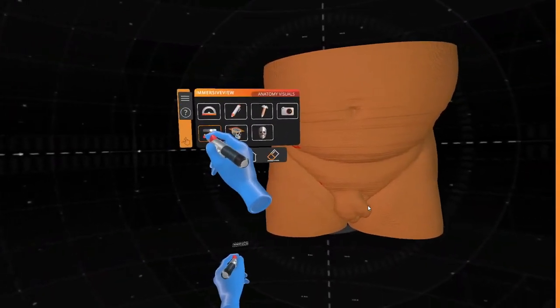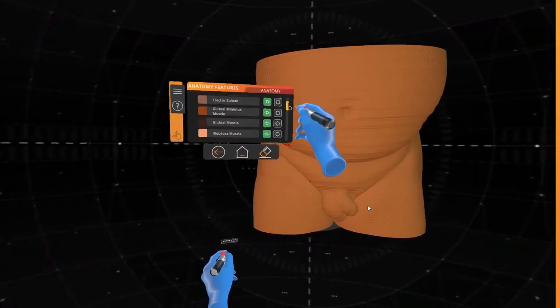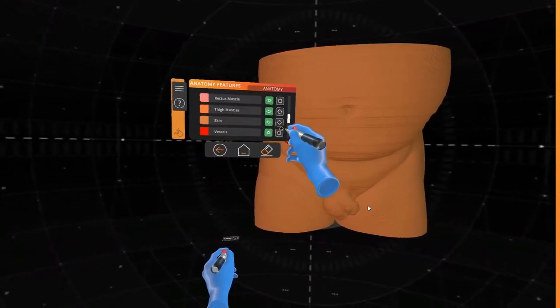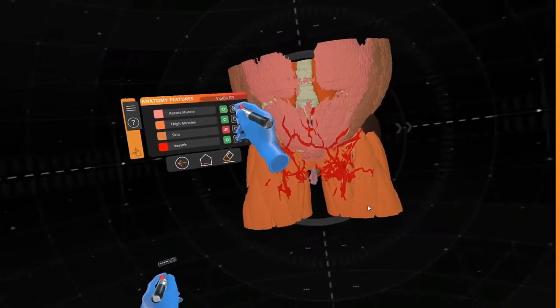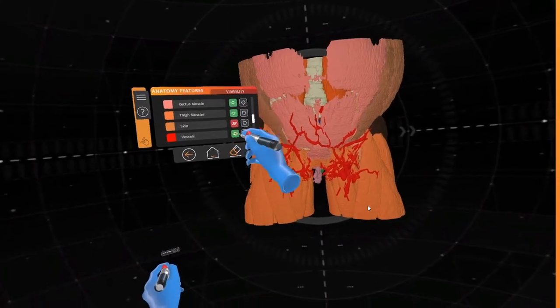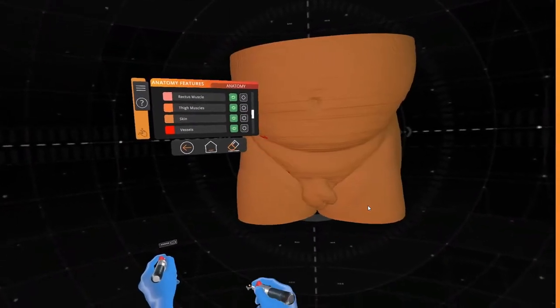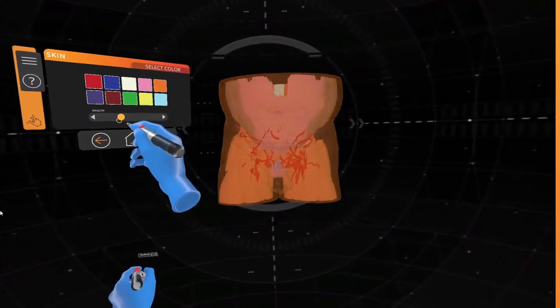Each anatomical structure is coded as a separate mask, allowing each structure to be manipulated individually. For instance, the skin and musculature can be hidden to reveal the underlying anatomical structures. Alternatively, the opacity of the layers can be adjusted.